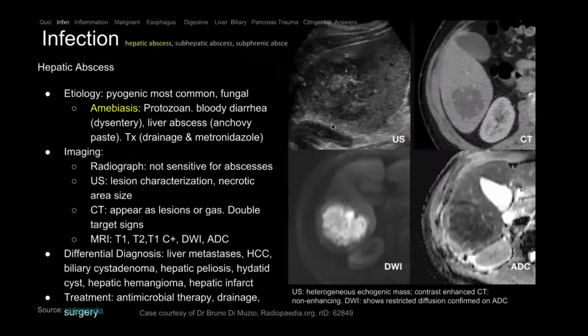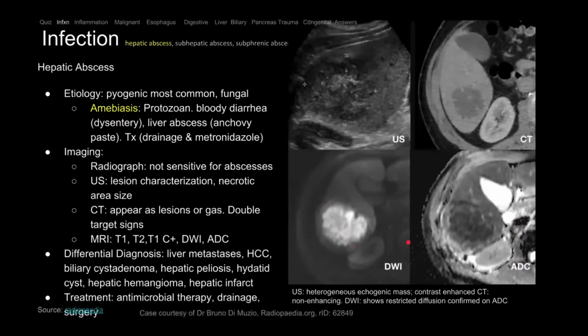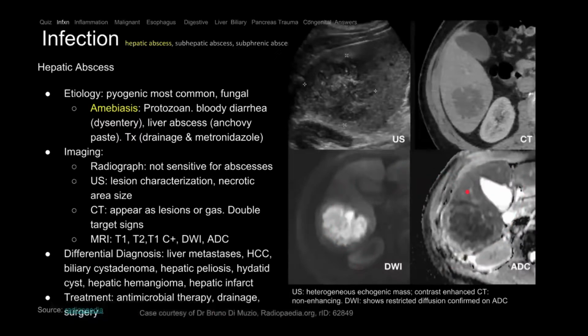Okay, so this one is, what kind of image is this? Good, ultrasound, and this one is CT in the right upper quadrant. These two images are what? MRI, you can think of it like your phone. On top of it, you have apps, so you can have a lot of different apps. So with MRI, you have the magnet, but within the magnet, you can put different recipes of sequences, which are like apps, and each sequence tells you slightly different information and serves a different function.